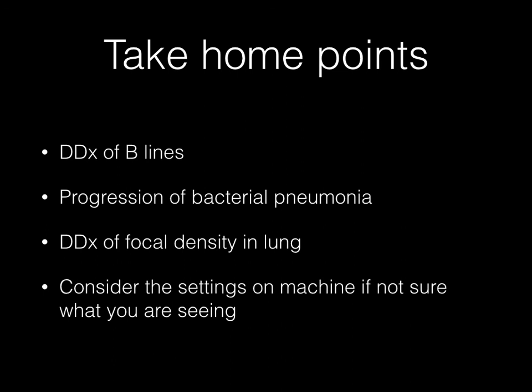We need to have a differential diagnosis for B lines. We need to have a thought about how bacterial pneumonia might progress, a differential diagnosis for focal densities, and then also consider the settings of our machine, especially if we're not sure what we're seeing.